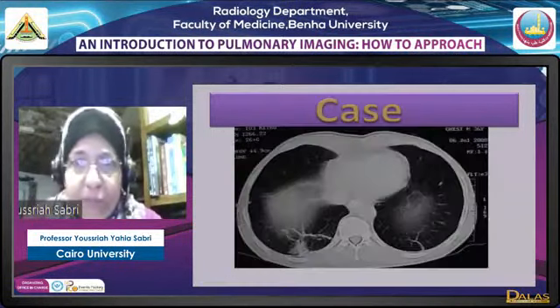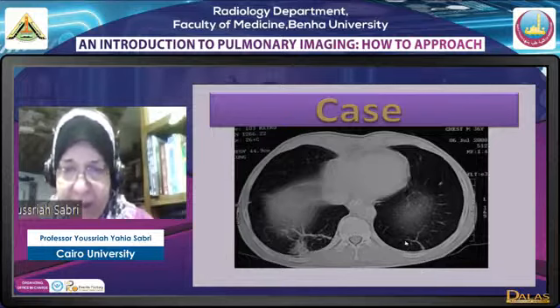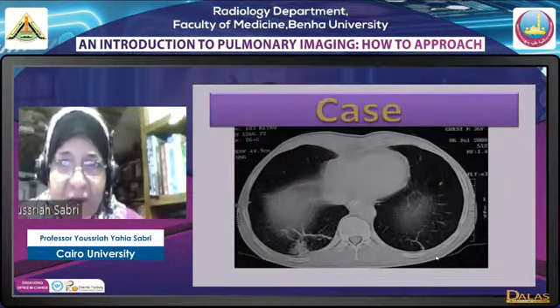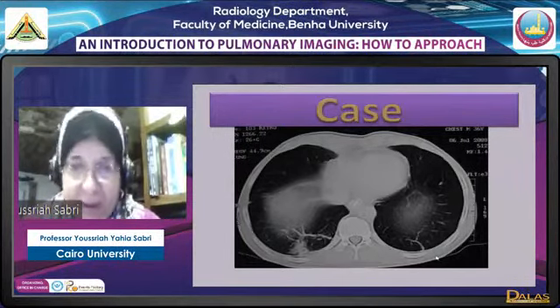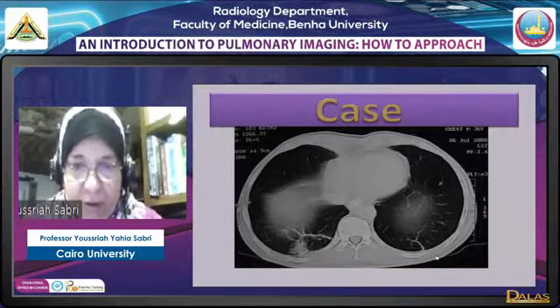Now here we have another pattern of fibrosis, which we call parenchymal bands, where we have a linear opacity reaching to the pleura, having an angle with the pleura. Bilaterality of the parenchymal bands in this 36-year-old male patient may suggest an etiology of vascular insults, previous infarction due to DVT or whatever, because of the appearance here.